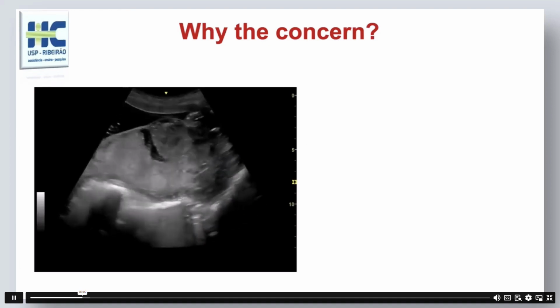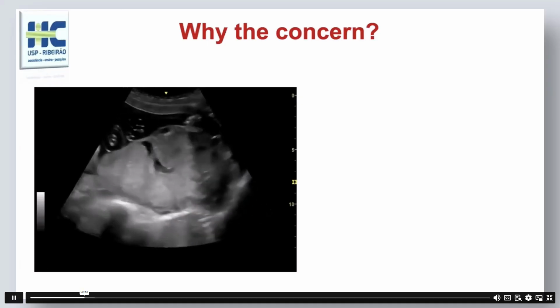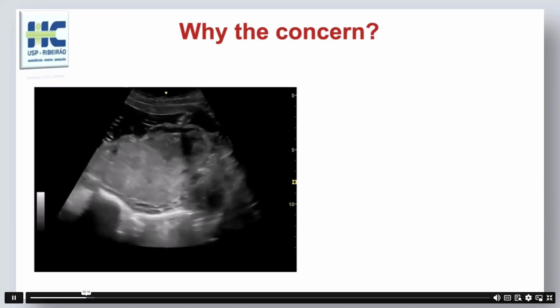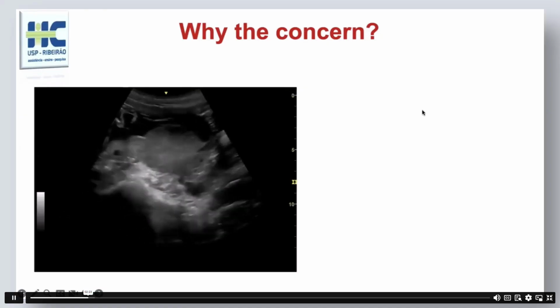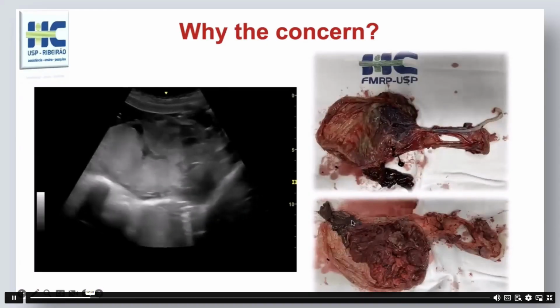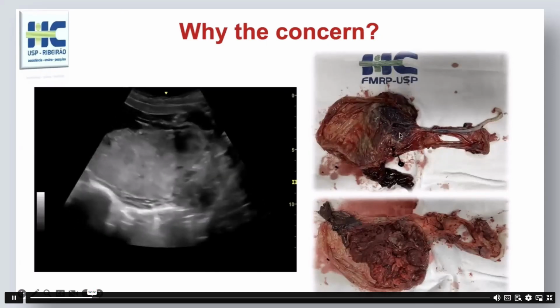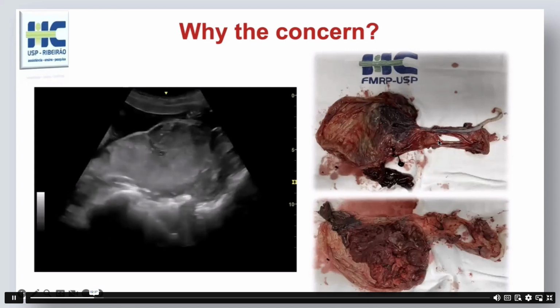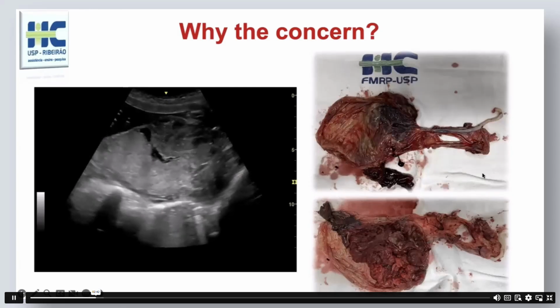We admitted the patient, introduced corticosteroids, and the patient went well for the next few days. But 5 days after this second bleeding, she had another episode of bleeding, but with uterine contractions, clinical signs of abruptio, and in fact, she had a new abruptio placenta, as we can see here, this clot. And that image was really a chronic hematoma on the fetal part of the placenta. But more than that, the patient also had velamentous cord insertion, as you can see here.